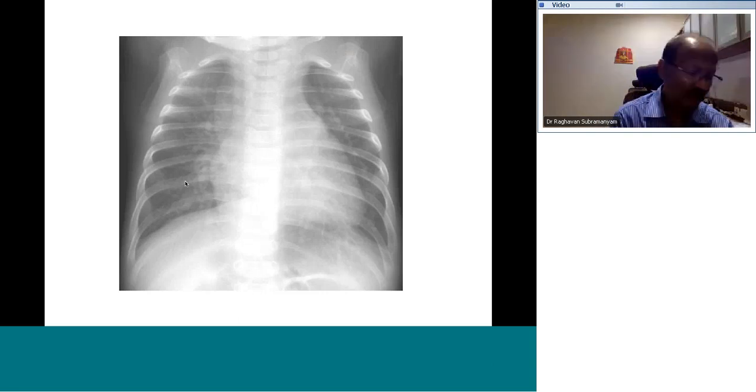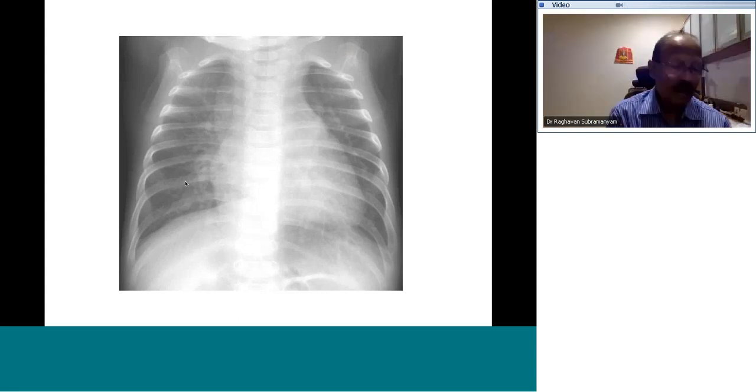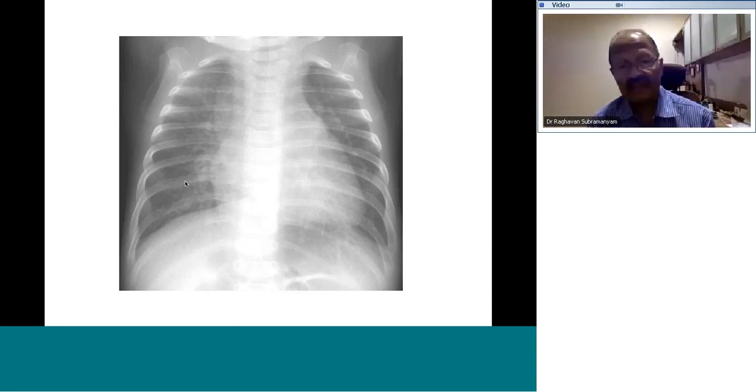Well, I guess I have talked a lot. Now let me see what you have picked up. I'm going to give you some time to answer these questions. Let's see what you have to pick out of this X-ray. Yes, who wants to answer that?